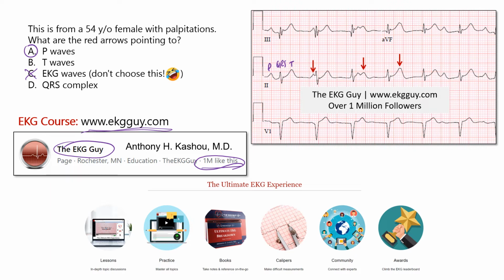Now this is actually a P wave that we're seeing, but notice how close it is to the QRS complex. Again, this is your QRS, and this is your T wave. Again, there's no P waves coming up, and what that arrow is pointing to is another P wave. It's a P wave buried within our T wave. And how do you know that? Well, look at this T wave here and those two that precede it. Notice the morphology that's changing here.